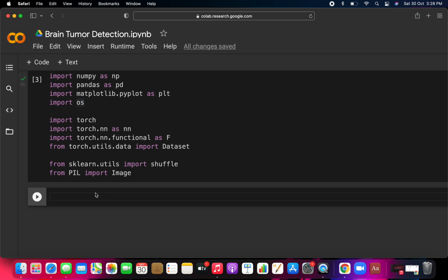This has already been run. After the next step, we will see whether the particular device you are using, laptop or desktop, supports GPU or not. If it supports GPU, you move all the arrays to tensors, moving all the tensors to GPU format. So it can be either CPU or GPU.